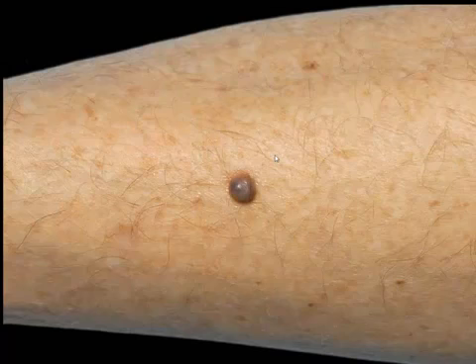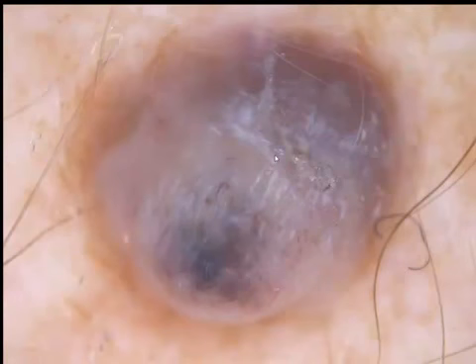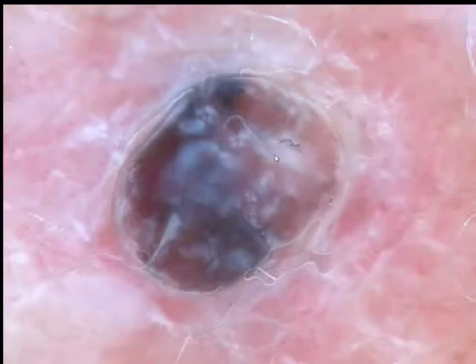This is a lesion that is a nodule. Dermoscopically, we see a structureless pattern with multiple colors, and the colors are those of melanin, which is brown, blue, and gray. We also see a clue, which are white lines, and the white lines indicate that it may be a BCC or it may be a melanoma, but in the presence of brown structureless at the periphery, it's more likely a melanoma, which it is.